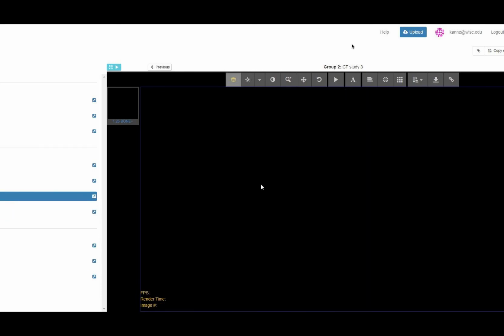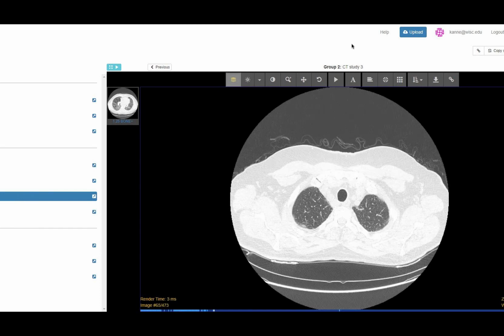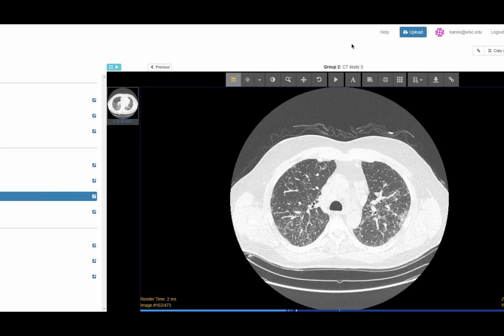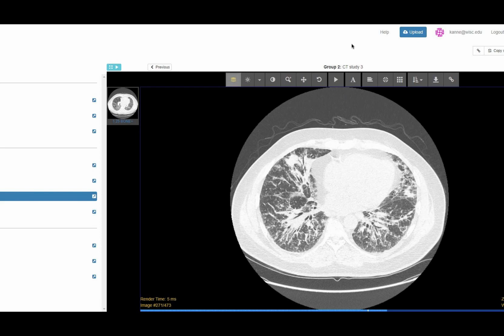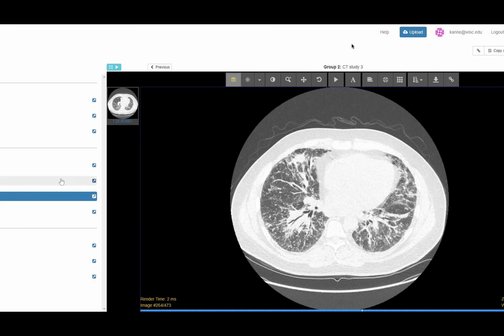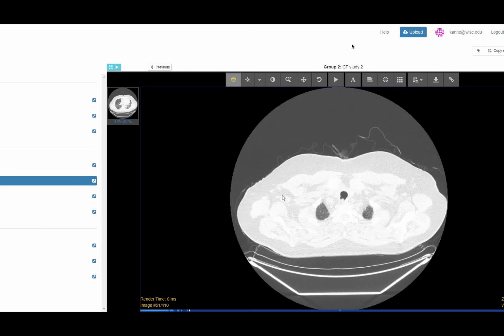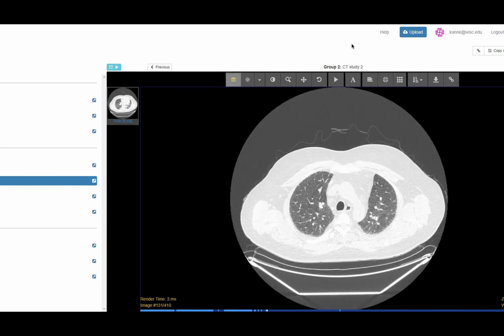The patient had a CT I think about a year after that. And it more convincingly looks like sarcoid at this point. I mean, there you go, there's classic perilymphatic nodules. I think everyone on this call would agree this is a good look for sarcoid. It's a little basal predominant, and then that stuff around the airways has definitely thickened up a little bit. And then the patient was treated for sarcoid with, I'm not sure exactly what the usual cocktails, probably some steroids. And then over time, this evolves to look like an NSIP pattern.